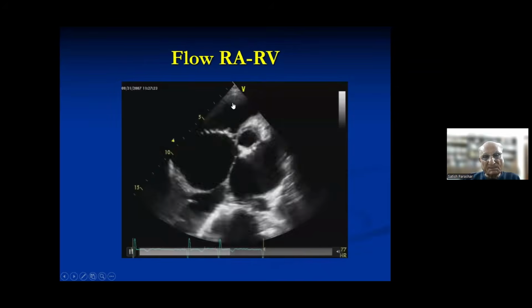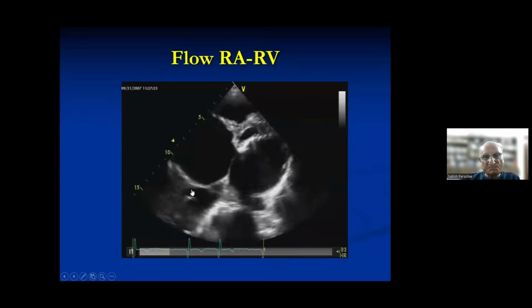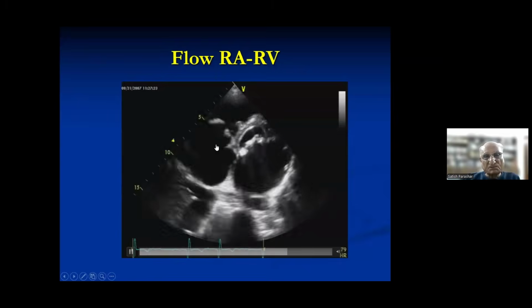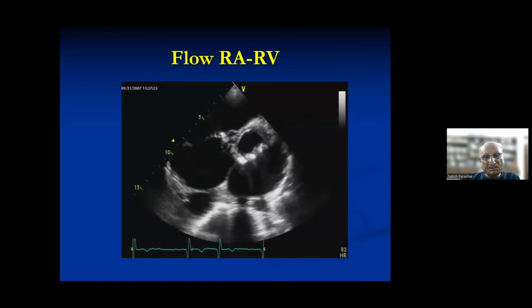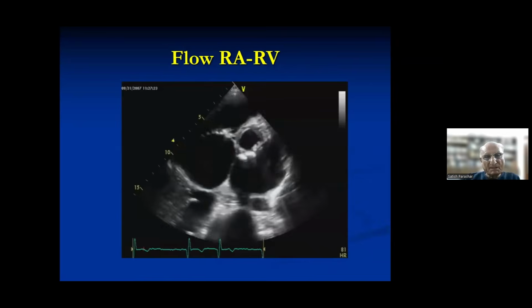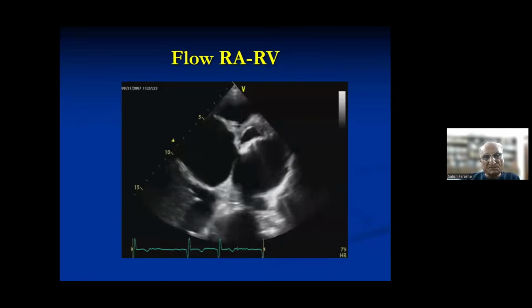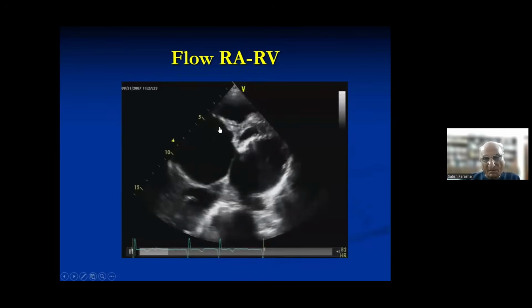So now by this example you have seen that this doming is a very important sign, and it is also associated with thickness. You can see the thickness of the cusp also. It is not only doming, it is a thickness, what we showed the first time also. So this is the thickness. Whichever wall you see will show a diseased wall, a doming toward the distal chamber, and a thickness.